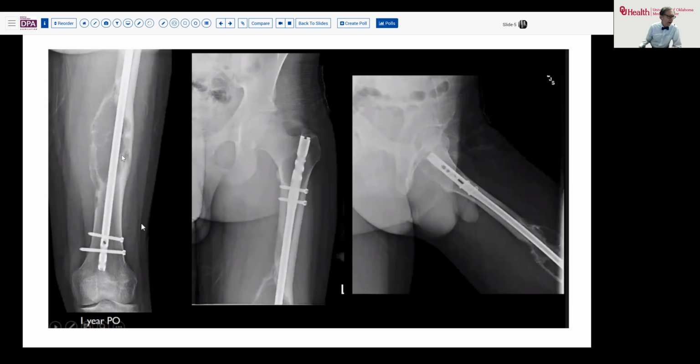So with that in mind, a very brave needle aspiration is performed to just get a little bit of a better idea of what's going on here. And from that needle aspiration cytology sample, we see bizarre atypical cells, big, chunky looking things. So it sort of rules out the small cell neoplasms and puts the money on an osteosarcoma as being the likely cause for this process.